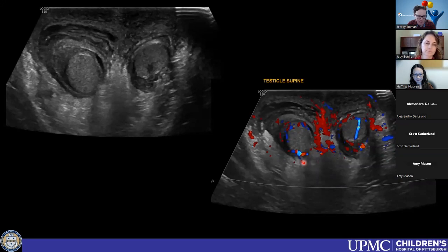I think the main thing to keep in mind is the overlap with other potential diagnoses, and the history is very important for helping us differentiate those things. An infectious cellulitis could also have this appearance. So knowing that this is painless and there's no clinical concern for infection, that's how I think about differentiating that.